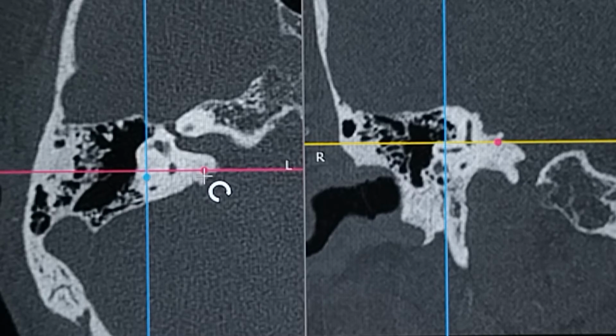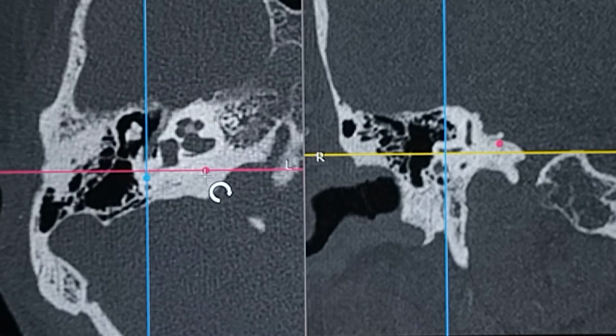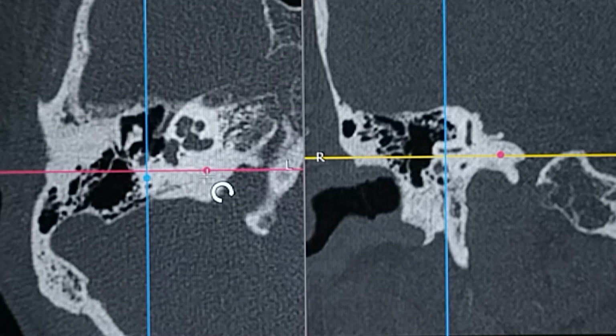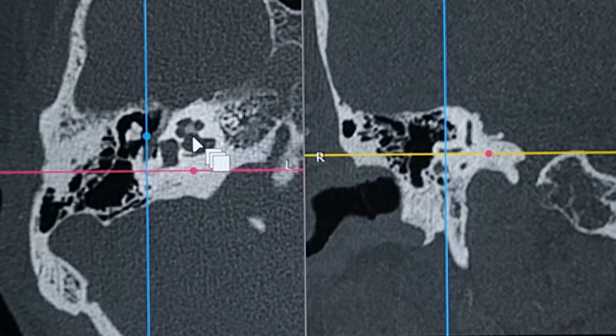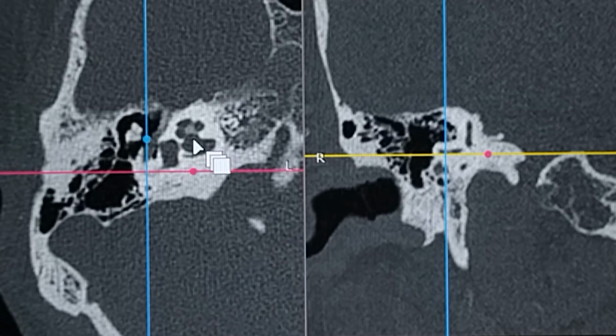So coming back from below to above, now I'm going to concentrate on the cochlea and the cochlear aperture. So this was basically the bony architecture of the cochlea, the cochlear modiolus, and you can see a white bone over here. That's the white bone, and you can see that this is basically the cochlear aperture. That is called the cochlear aperture, for the passage of the cochlear nerve.